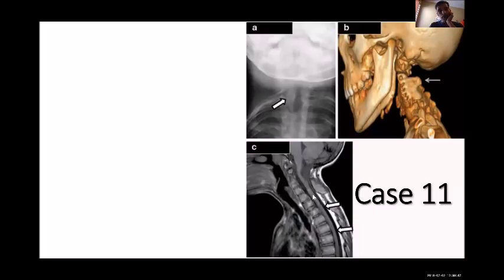Lily Mark, well, first your typing is not proper, because Turner starts with a capital, and syndrome there is an E. Second, that's my advice to you, don't jump to diagnosis, just describe first what you see. You might be correct, I'm not sure, but just try to describe.